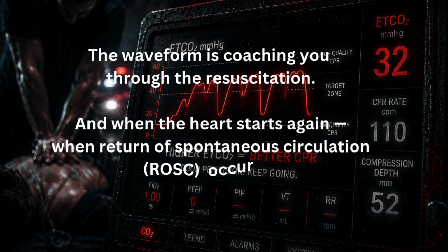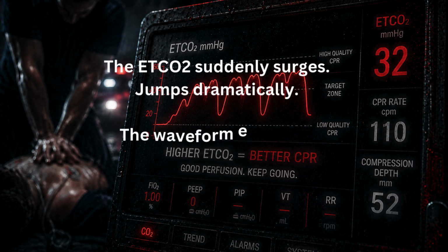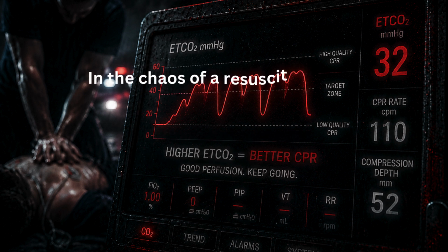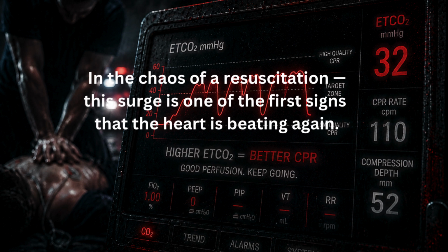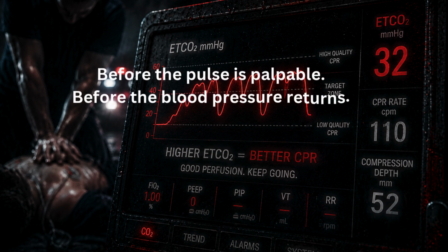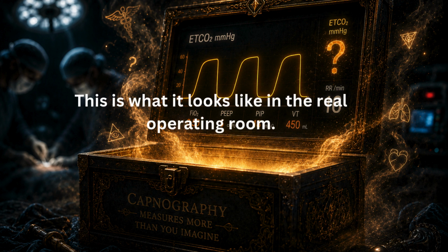And when the heart starts again, when ROSC occurs, the ETCO₂ suddenly surges, jumps dramatically. The waveform explodes back to life on the screen. In the chaos of a resuscitation, this surge is one of the first signs that the heart is beating again, before the pulse is palpable, before the blood pressure returns. The capnography knows.